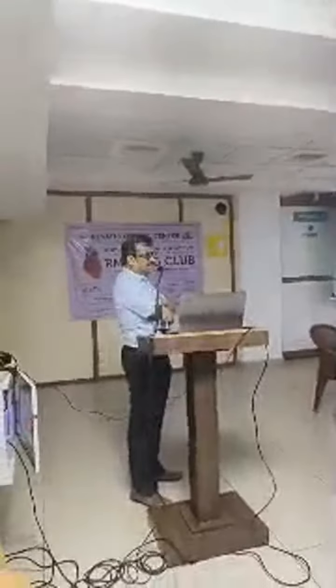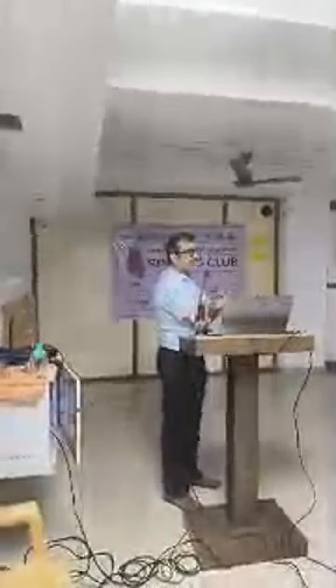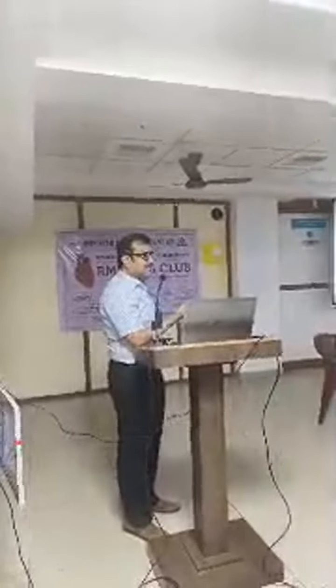Very nice topic. Very nice discussion, Lawrence. I think Dr. Narak wanted me to talk about how to start the basics of ECG. The primary reason you do an ECG is to treat your patients. I felt that case scenarios will trigger more interest in you to understand how important ECG is, particularly in non-cardiac situations. Whenever we do an ECG, we always look at cardiac arrhythmias, MI or acute coronary syndrome. These are the times when you think about an ECG.